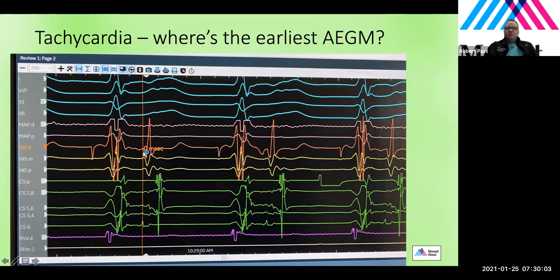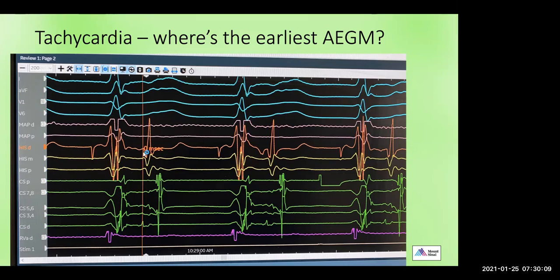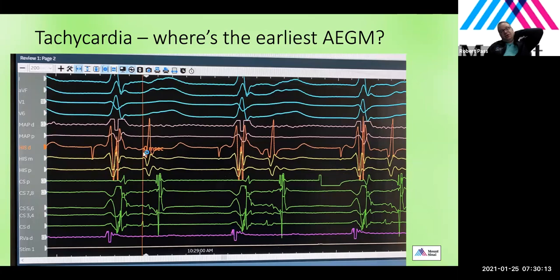So if this was AVNRT, would this be typical or atypical AVNRT? Atypical. That's correct. So the only way to explain this tachycardia would be to say that it's either some kind of pathway on the right side of the heart, or that the patient is a very unlucky person in that they have WPW on the left side of the heart, but they also have AVNRT.